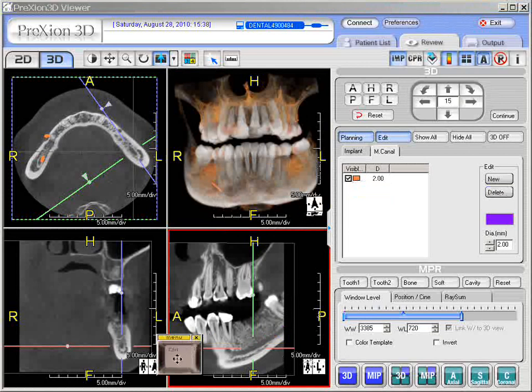Alright, back to marking the canal. Hold the control key down, take your little arrow with the little sunshine icon, and you're going to click along the length. Okay, and if you're clicking and you don't see the little sunshine icon, chances are we had to go back and click new and create that second line again when we deleted it. So now we're just going to hold the left click of the mouse and hold the control key down, left click our green circles along the length of the left mandibular canal.